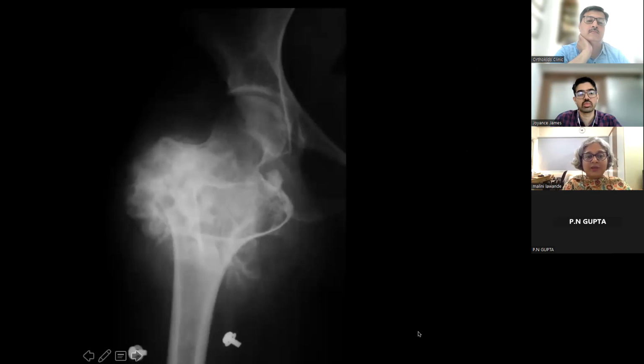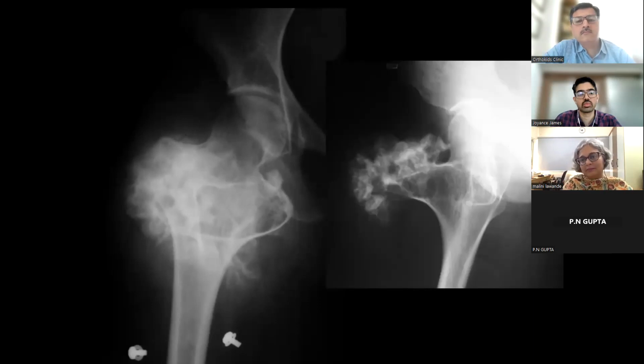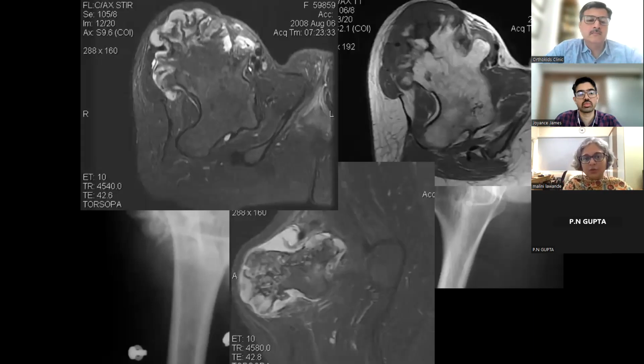Certain times you have radiograph like this, which again, you're not sure what is happening. So again, one view is no view. The other view is clearly showing this is an osteochondroma. Why would you do MR in this? Because it's clearly an osteochondroma. It can be if there's a sudden increase in the size, if there's sudden pain, then I want to look for this cartilage thickness. So the cartilage thickness can be evaluated very well on MRI. And if there is malignant transformation, that can be seen.